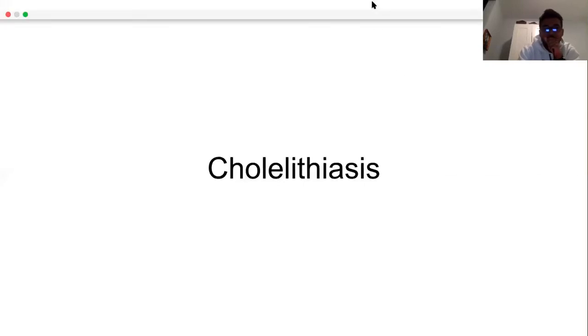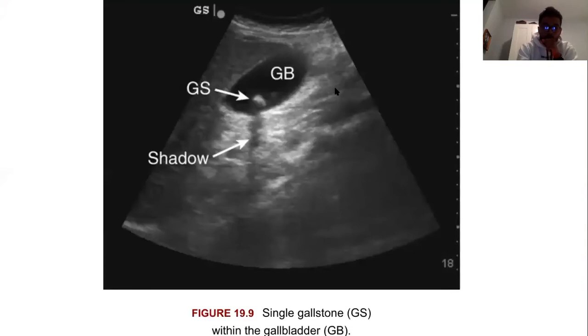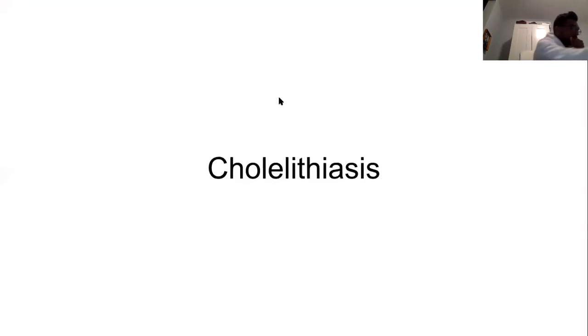Okay, next we have cholelithiasis, gallstones. One particular thing about gallstones is one specific sign that they always tell you to look for. What is it, Kenny? What do they tell you to look for? Murphy's, yeah. Murphy's sign. And that posterior shadow, right?